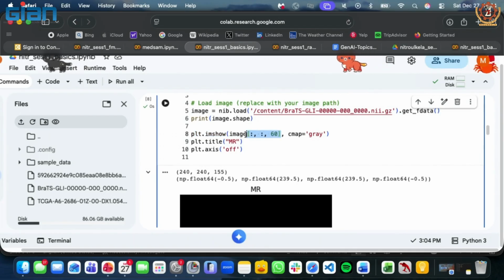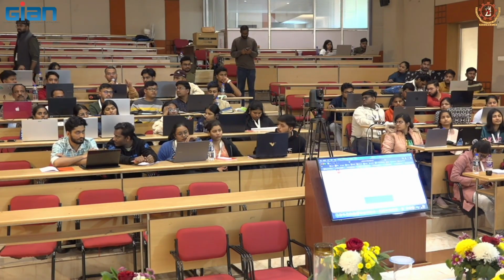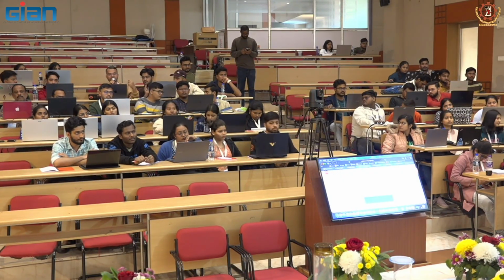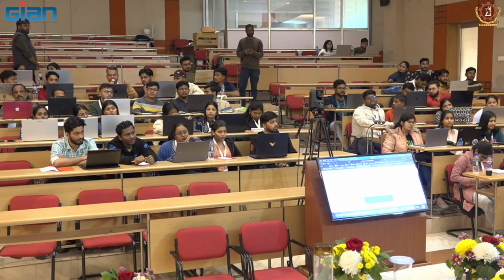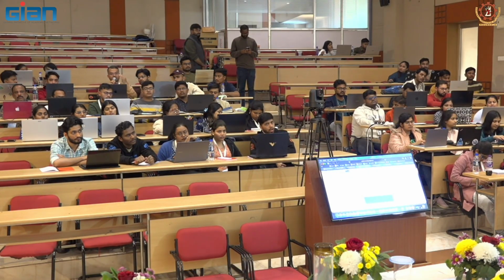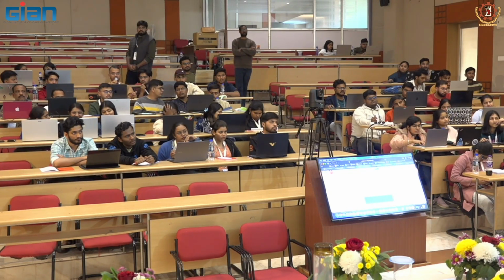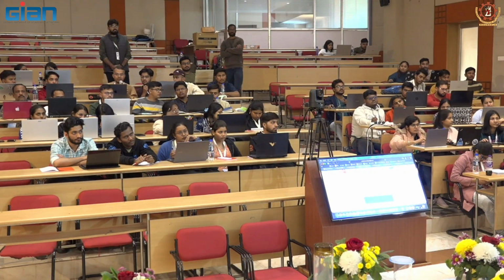So any idea what this means? Image in square brackets, colon, comma, colon, comma, 60. Array slicing. You guys might have taken the Python course. Can somebody explain a bit more in detail in the mic? Yes, so what it does is array slicing. Here we have put the first one as colon and the second one as colon, which means the x and y axes, it will take all the data. And the third value in that bracket we have used 60, so I'm just taking the 60th element.